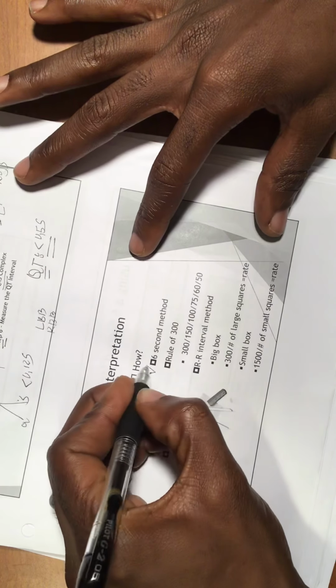To determine the rate of a rhythm, or of an EKG, what do you have to do? There are a lot of rules, so we're going to learn the one that the American Heart Association is using now. So it's important. When you look at an EKG to determine the rate, you could be trying to say that it's sinus tachycardia, atrial fibrillation, or something else. Firstly, we talk about the 6 second method. We'll show you some strips to show you how to do that.